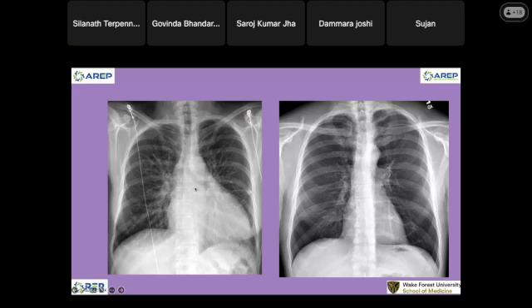But big heart, look at pulmonary vasculature. Look at here, my hilum, and close up. Look at it carefully here. If you can magnify it, I cannot do it from here. See how busy this vessel is. And look at the upper lobe vessel is big. Lower lobe vessel is big. They're all big. But look at this upper lobe vessel, in a normal person, it's not big. It looks nice and clean. And if you go a little bit down here, you see these little lines. That is Kerley B lines, which indicate interstitial pulmonary edema.